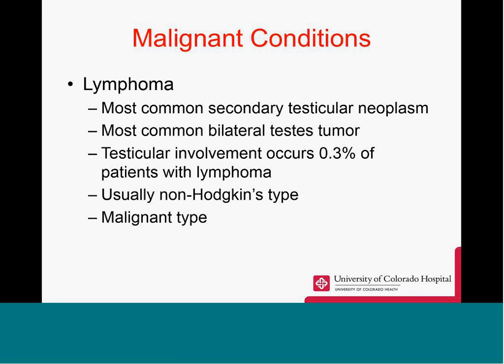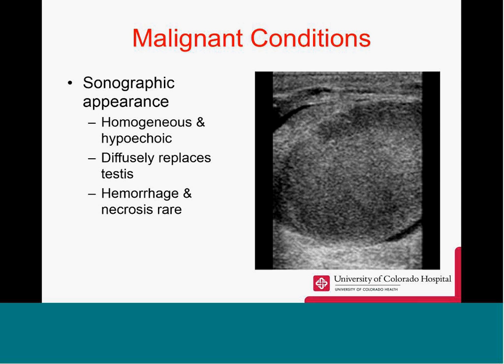They're going to present with a painless testicular enlargement with symptoms of fever, weakness, anorexia, and weight loss. On ultrasound, it's going to be homogeneous and hypoechoic here. It does diffusely replace the testis. And with this tumor, hemorrhage and necrosis are rare.